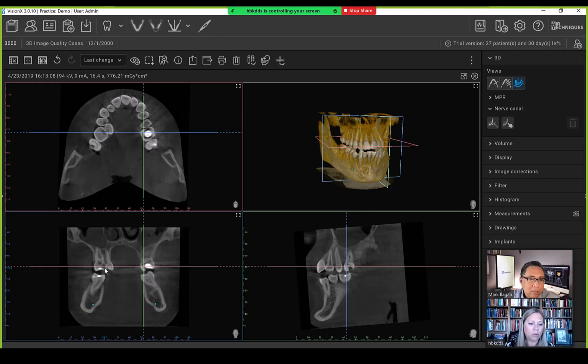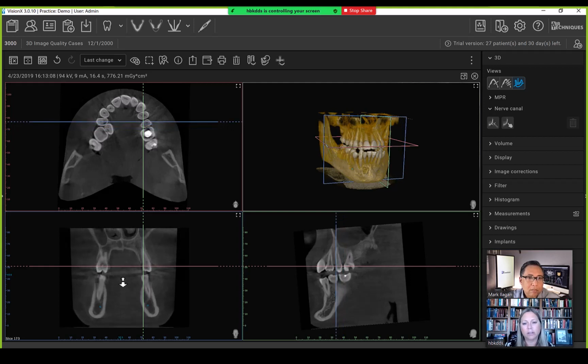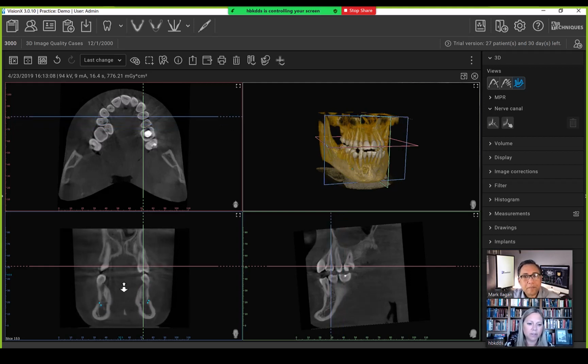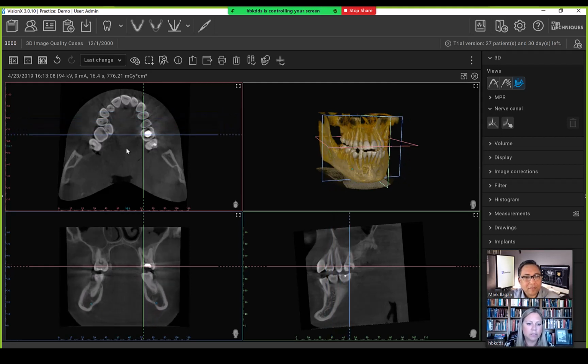Now, if the patient has no metallic restorations, we might go ahead and say, it looks like we have some coronal loss of tooth structure that may be suggestive of caries, but we don't come straight out and say they're caries. So we're kind of careful in our wording there just because we know that this can happen.